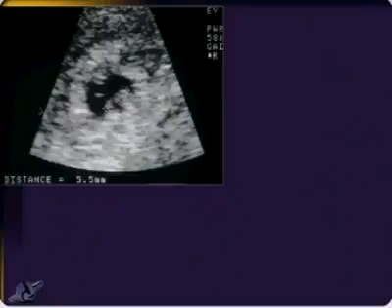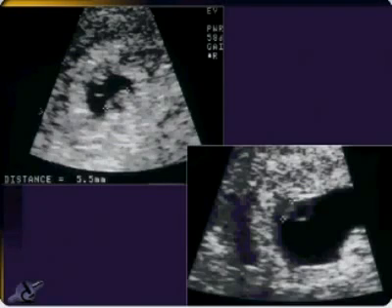No heartbeat, okay? Well, she goes home, and lo and behold, no bleeding, no cramping, nothing goes on over the next week. And they check her HCG, it's going up in a normal fashion. She comes back and there was a normal little embryo there with a heartbeat. Well, what the heck went wrong here?